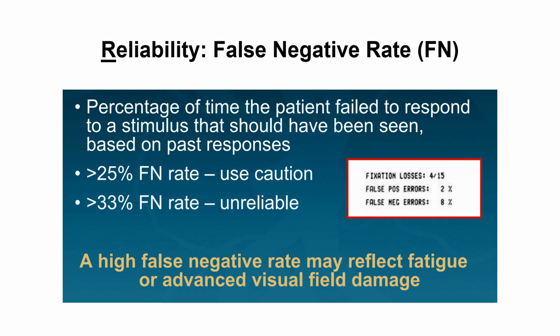Why? Because in advanced visual field damage, the false negative rate will be higher, because of the variability in receiving the stimulus in these advanced visual field damage locations.